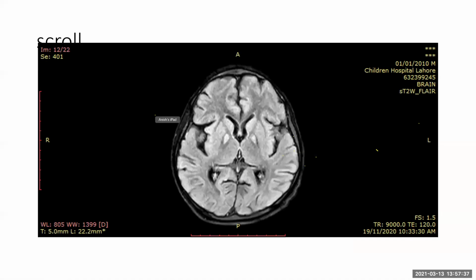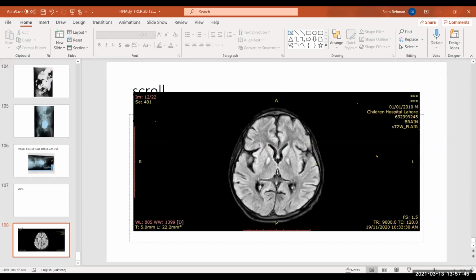Madam, the last case, people are asking again about the hyperintense globus pallidus. People could not hear the diagnosis. This one, yes. Okay. I'll show you the DICOM for it. So if you see the coronal images, that would be better, right?